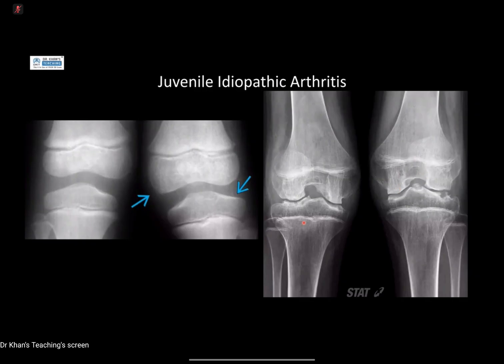To be fair, if you are looking at symmetrical changes on both sides without one to compare, then in the absence of other symptoms and with a purely isolated widened intercondylar notch, I think it's hard to pick up. Often I have to go back and compare with age-matched controls to say, is it truly widened or is it just a projection thing?